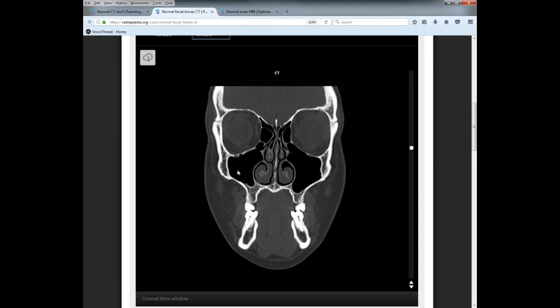Now, having fluid in the sinus is not necessarily an indication that there's definitely a fracture, because they could just have fluid in their sinus. But when you have someone who comes in and you're doing a CAT scan and they have this hugely swollen eye, and they were punched in the eye, or they fell and hit their eye, and they question a fracture, and you see fluid in one and not the other, chances are there's an orbital floor fracture, or what we call a blowout fracture.